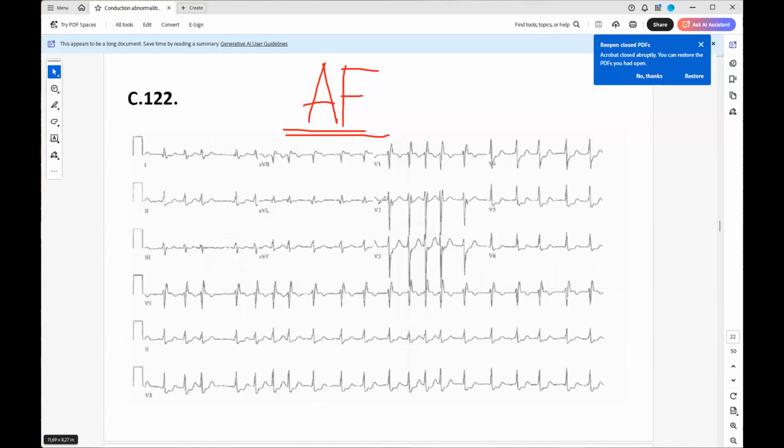But that's rhythmic. If it's arrhythmic and we do have different P waves, that means we do have a multifocal atrial tachycardia or impulse formation. If we do have arrhythmia absoluta with sinus P wave, that's a sick sinus syndrome. This is what we discussed the last time.